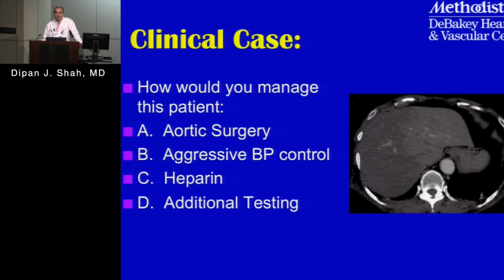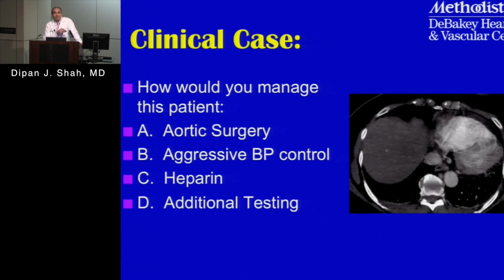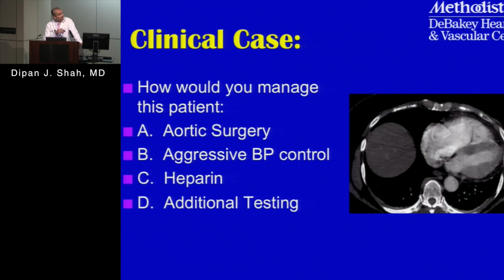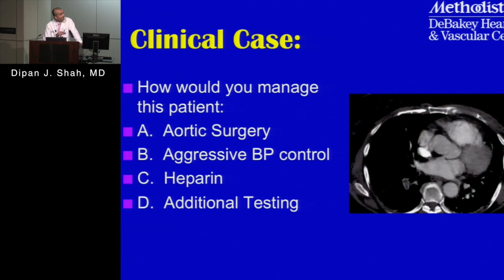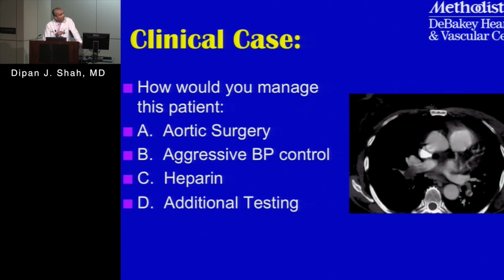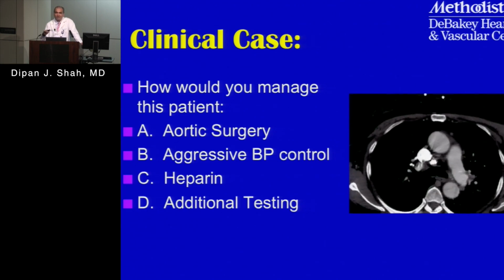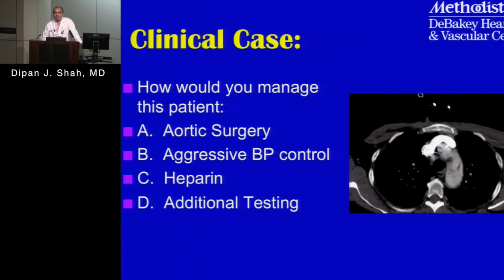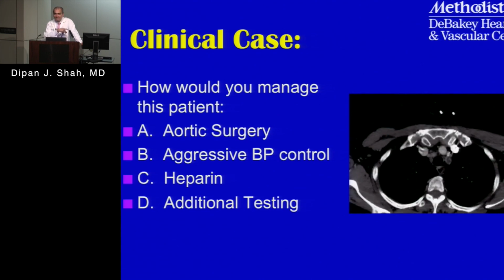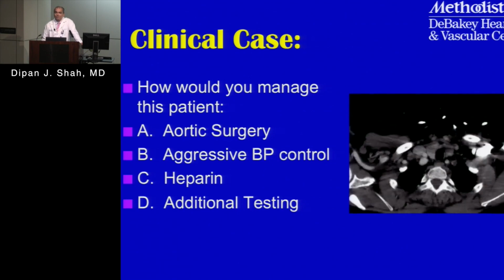If you look at these images here, you've got really bilateral filling defects, right? And the timing here is not bad. Faisal can chime in from CT, but the issue obviously is you can get filling defects if you've got inadequate opacification. But in this case, this is pretty well timed for the pulmonary artery as well. You don't see a lot of mixing throughout the rest of the pulmonary artery. So I think this looks pretty convincing for pulmonary embolism, right?